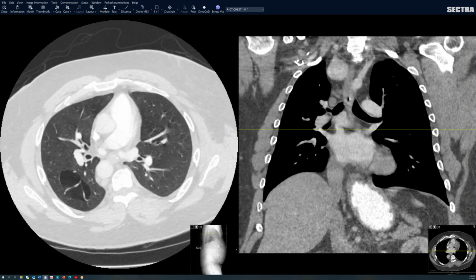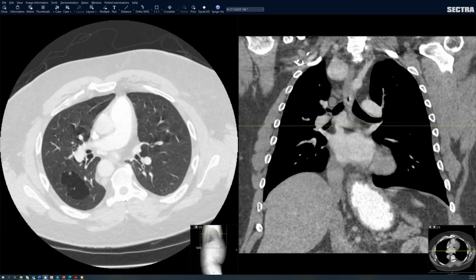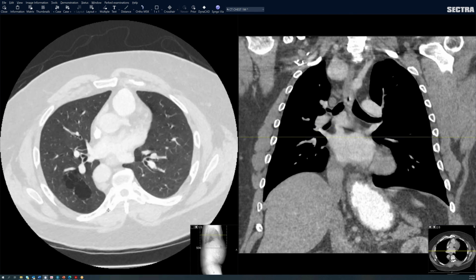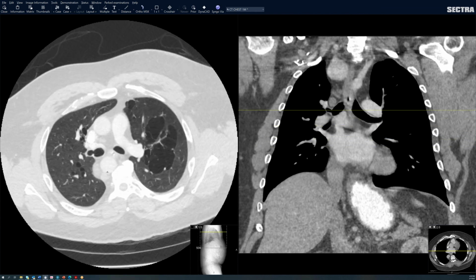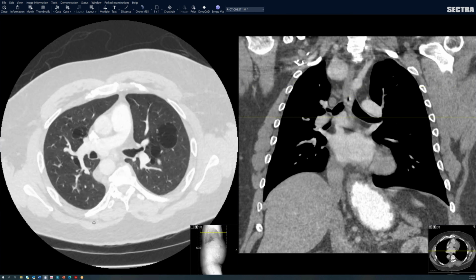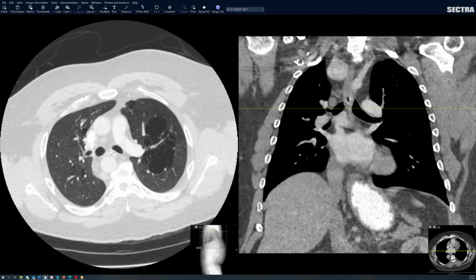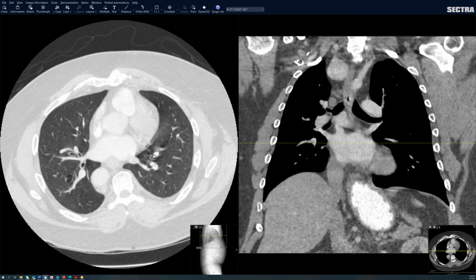The pulmonary veins were all draining appropriately, and these were just centrilobular. But yeah, are the veins... You mentioned the word cystic. Do you actually think it's... it's a little hard for me to tell. Are they actually cysts, or are they just... I can't tell, but you said they are actually cysts? I don't think these are emphysematous blebs or emphysematous changes.